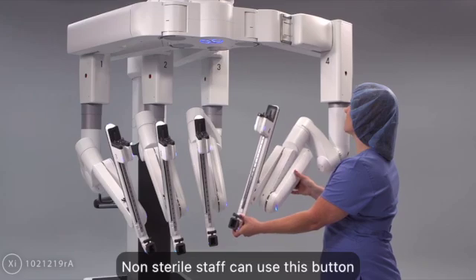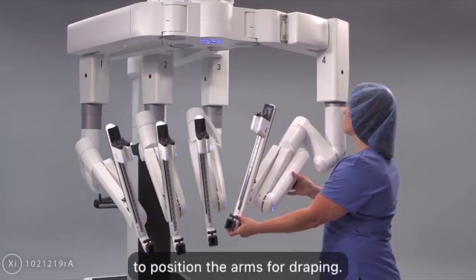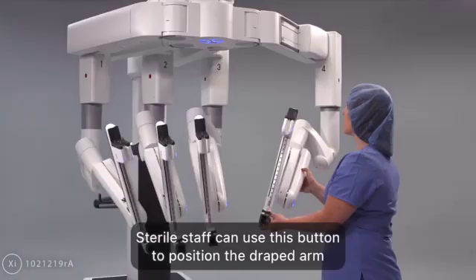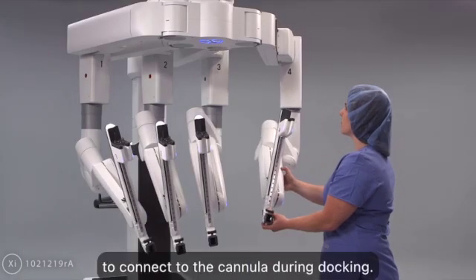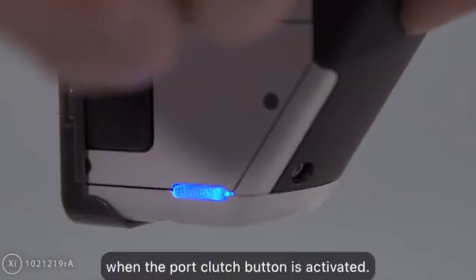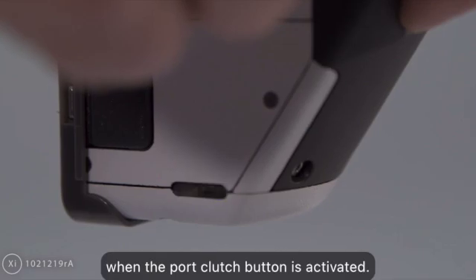Non-sterile staff can use this button when the system is undraped to position the arms for draping. Sterile staff can use this button to position the draped arm to connect to the cannula during docking. The cannula mount LED blinks blue when the port clutch button is activated.